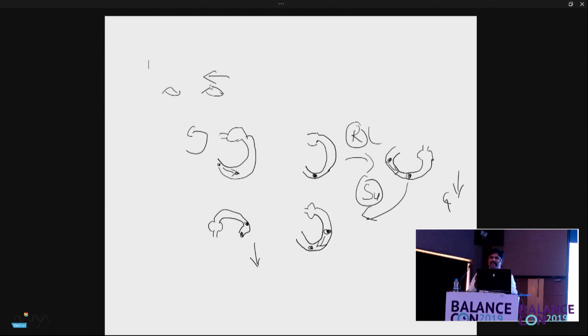There are some differences, patterns that can be seen when multiple canals are involved, based on so many other factors, such as where exactly in the initial position, which was the most dependent position because of anatomical factors. All those things we can discuss. But the main intention here was to make a strong foundation as to how you can look at the graph and find out what is happening in the inner ear. That is number one.